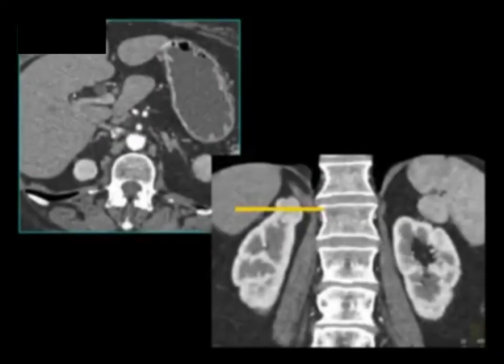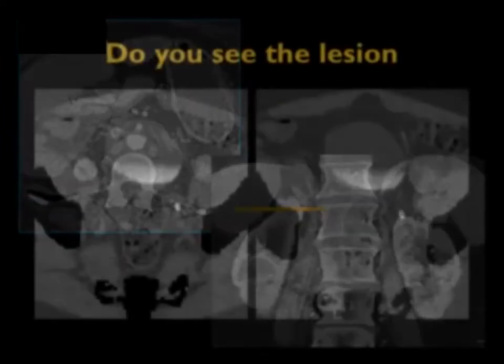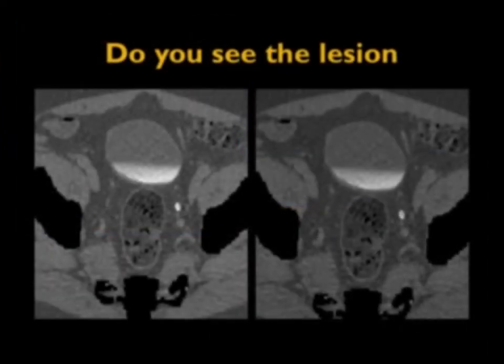And here's just a wonderful example of a renal cell carcinoma that was easy to pick up. Vascular clear cell, the patient's done fine, but very easy to miss if you only looked in the axial plane. Now, I'll talk about the ureter in a special talk, but just to show you several points about how subtle things are.